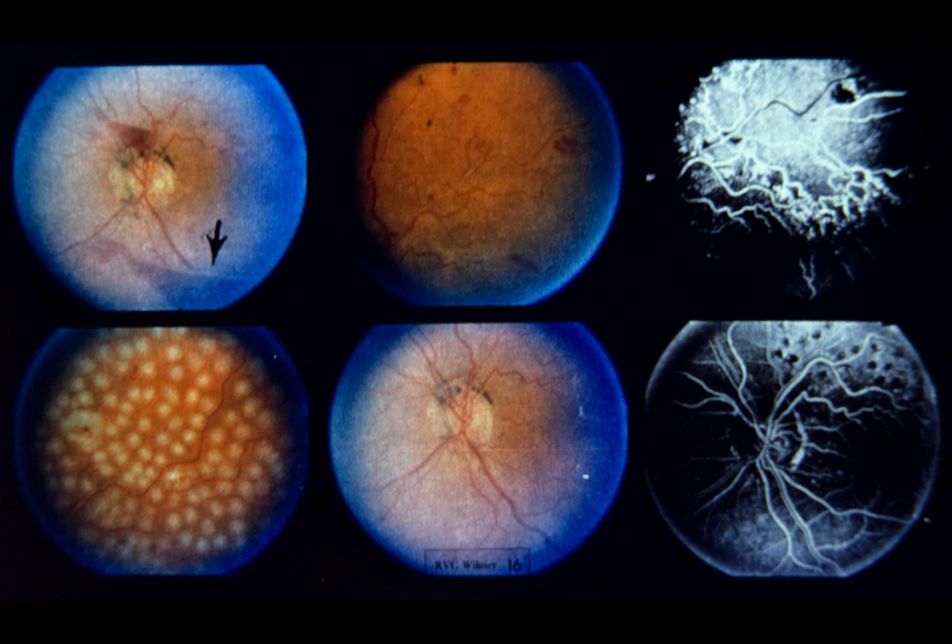Comment: disc neovascularization represents one of the complications of branch retinal vein occlusion and may occur in up to 20% of patients with major venous occlusion. When disc neovascularization is present, one usually finds extensive capillary dropout in the area drained by the obstructed retinal vein. Scatter-type photocoagulation appears to be effective in promoting regression of disc neovascularization in such cases.